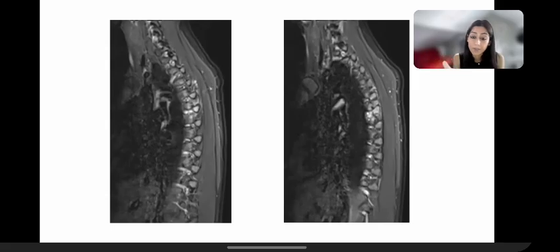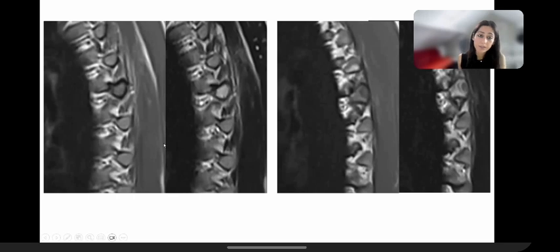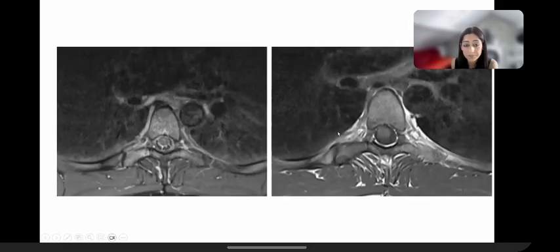So that's a case of ankylosing spondylitis or non-rheumatoid inflammatory spondyloarthropathy. In this case, if you look at the further magnified images, you have the T1 and T2. Just look at the cortex of this bone. That's not quite right. There aren't erosions, but the cortex is really thickened. And once again, there is hyperintensity on the T2 weighted sequences, and this ovoid focus of low signal.